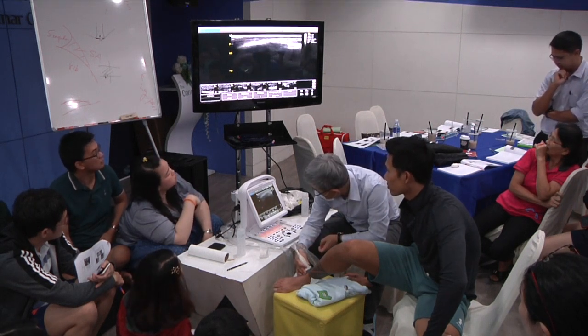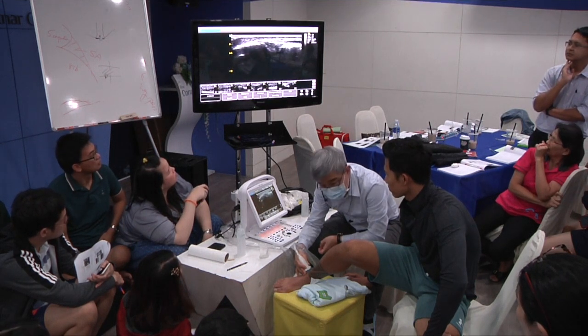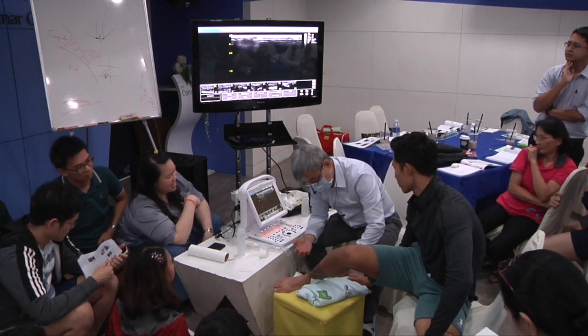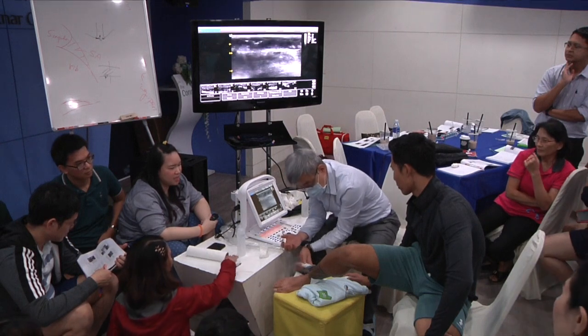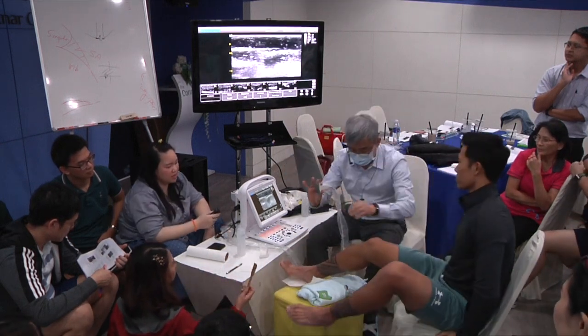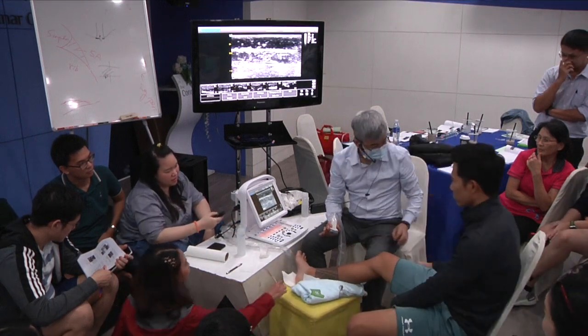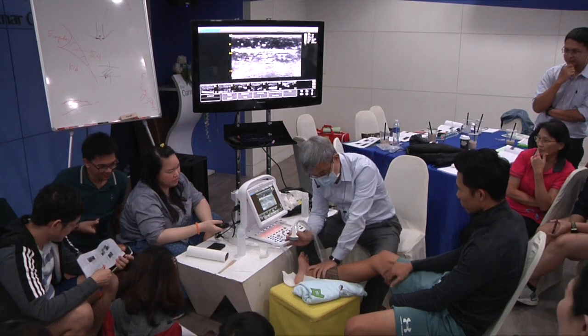Finish. AITFL. Thank you very much. Next one. Next 3. Deltoid ligament. Right, good. The same, very, very useful.